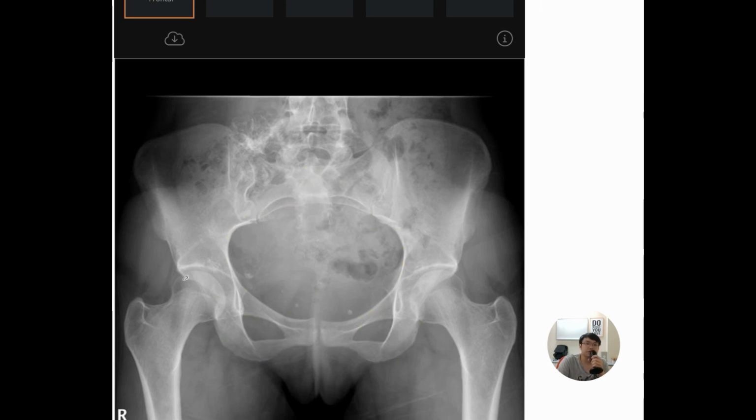Then you also check the bilateral femurs, but do have two review areas in mind. One, try to see through the bone and look for any abnormal sclerosis. Sometimes there may be an abnormality at the covering acetabulum or the overlapping femoral head, okay? So there is no abnormal density or fracture.